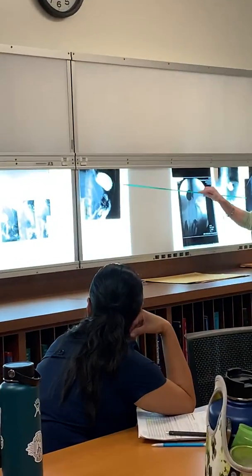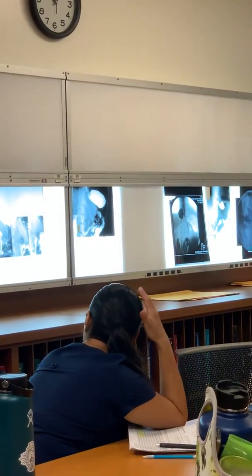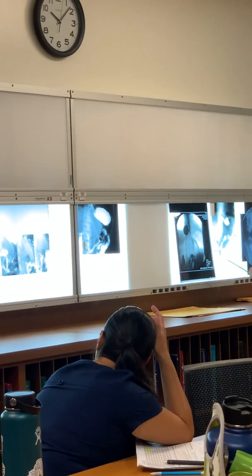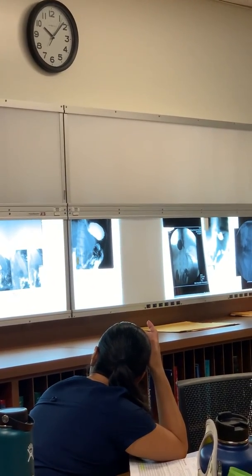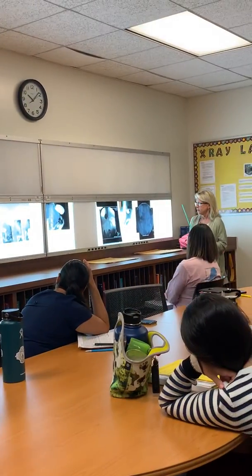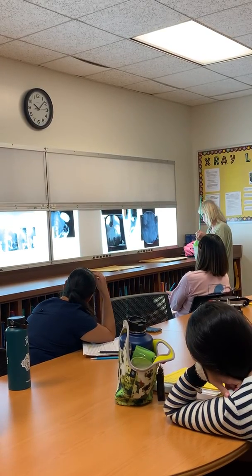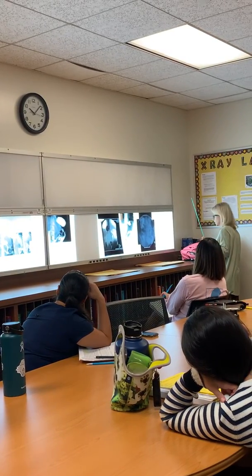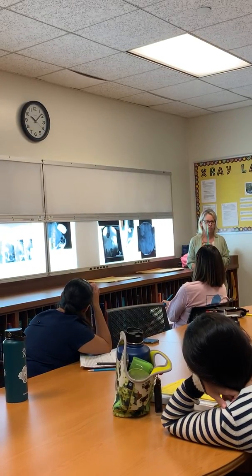Okay. There's barium. So we know that they were supine somehow or another. But remember, an RAO is the mirror image of an LPO. So that's what that is, only because we hang it that way. You view it like you're looking at the patient. This one is an image taken from the image intensifier or the fluoro unit. So that's why the densities are reversed.